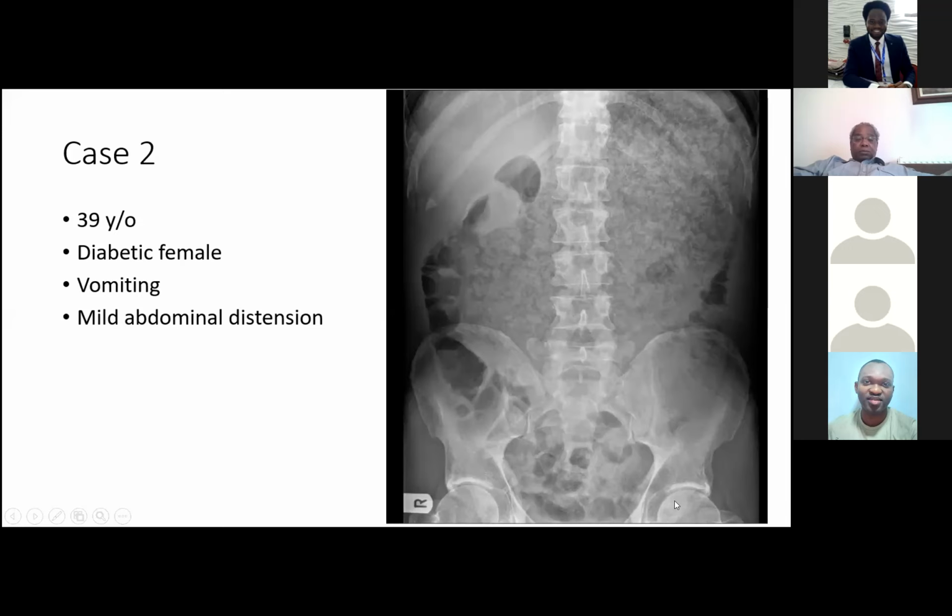Good. Do you have an idea what anatomical structure this might represent? You've described it quite well in terms of where it's extending from, and that description, if someone was on the phone, they could actually have a reasonable idea based on what you've said in terms of what anatomical structure fits that description in terms of location.